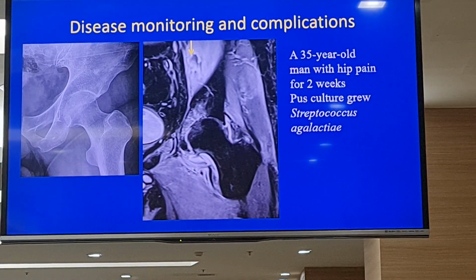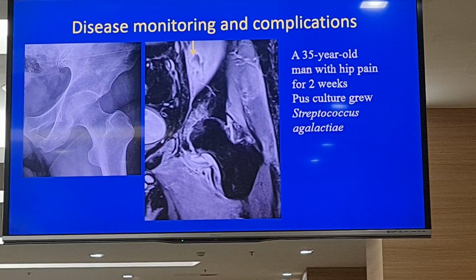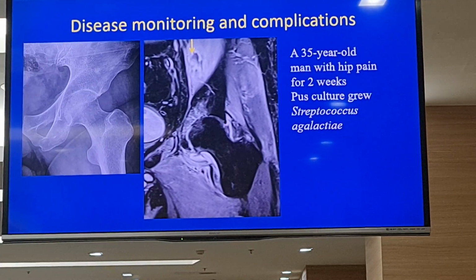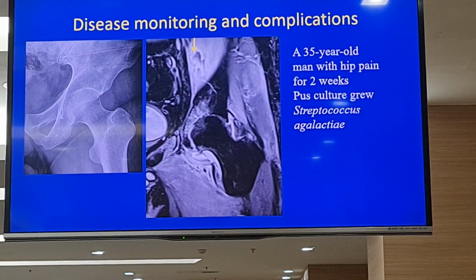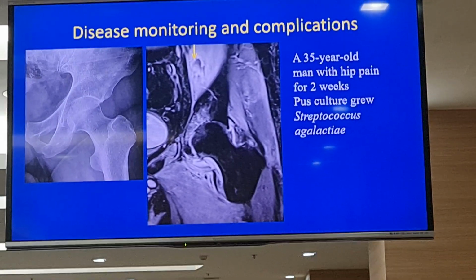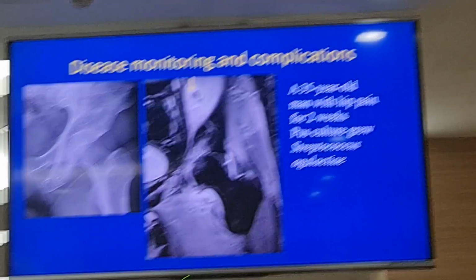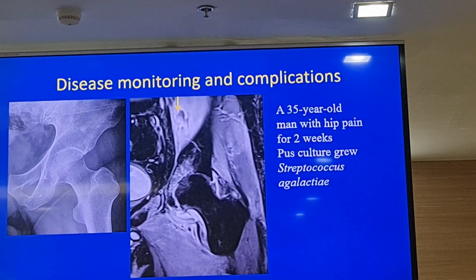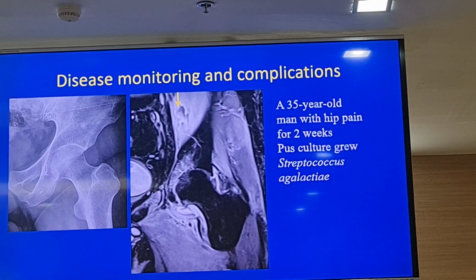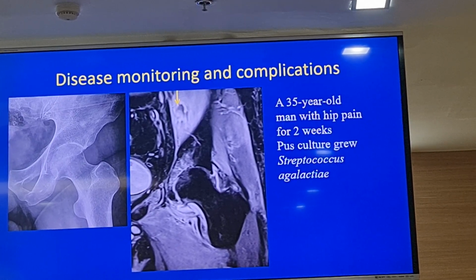So this is initial joint disease. Okay, for those who are non-radiologists, consider joint space narrowing because of loss of cartilage. And this can be shown by MRI, as the patient has bone marrow edema and narrowing of the joint and synovitis.